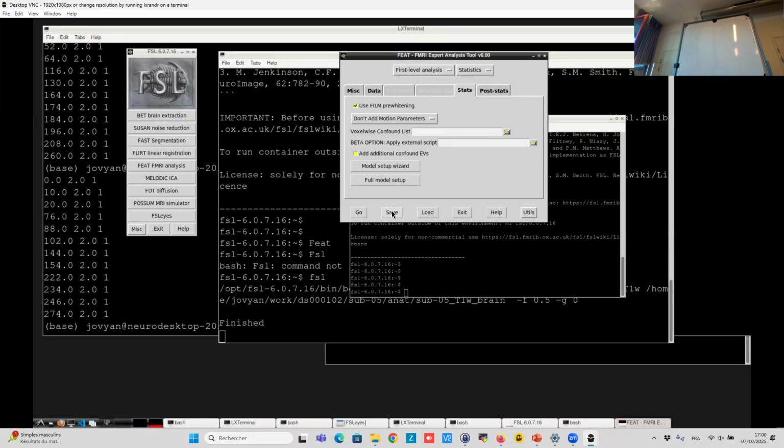If you run feat, not capital FEAT but normal feat, with the name of this file, you rerun it. Inside is just a txt file with the name of this folder and what you're doing: the pre-registration, the registration, the smoothing, everything. So you can change the file to do what you want.